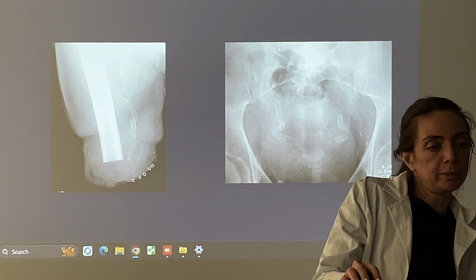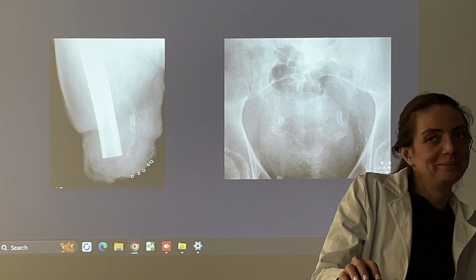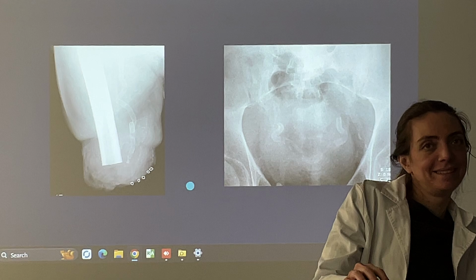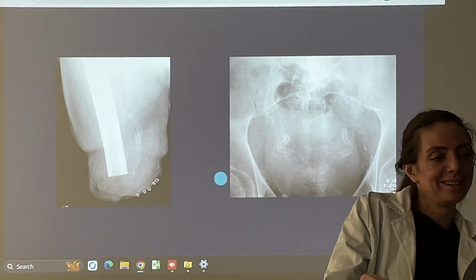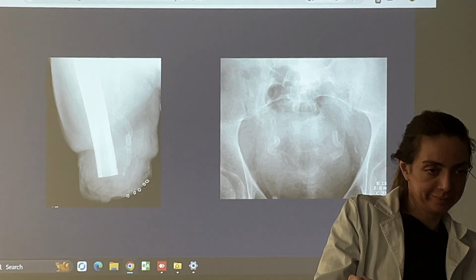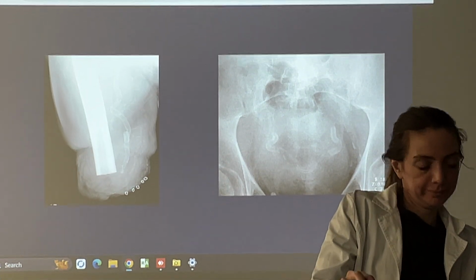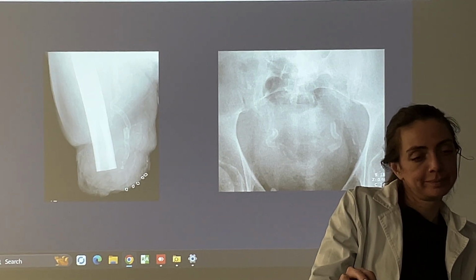What can you say is abnormal? Something in the ureters. What is calcified? What is this? On this we can see ureters. On this two. These two are ureters. Okay, the ureter is calcified. Okay, now this picture.